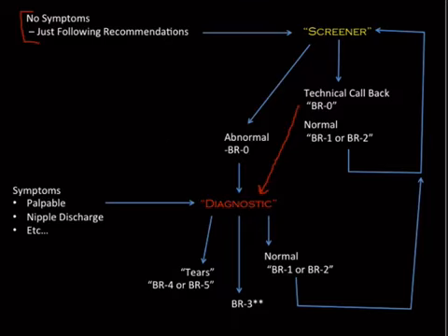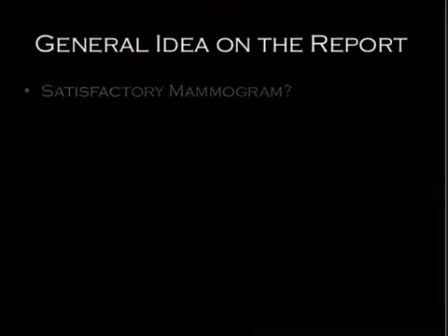So understanding this is really important. And for people who have done mammography in the United States, it's easy, but if you haven't, it's often very foreign and challenging. So let's practice. Let's do one together.